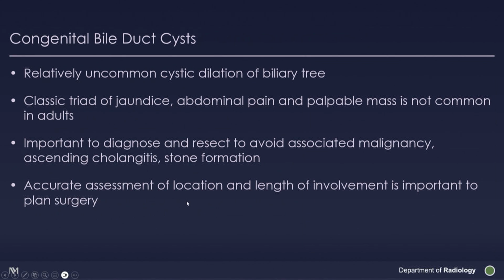This brings me to congenital bile duct cysts, and I probably could talk for half an hour just on the bile duct cysts, but I want you to at least be aware of it. They're not that common, but you do see them.